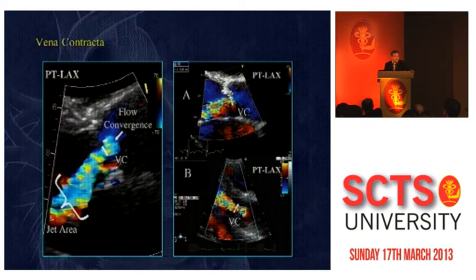And severe aortic regurgitation is a very large jet, one with a vena contracta that is more than 6 millimeters, one with a pressure half-time that is short, with a holodiastolic flow reversal in the descending aorta, and with enlargement of the left ventricle. This is very important. And then, of course, you can make all the measurements from a quantitative point of view with the regurgitant volume and the regurgitant orifice area.